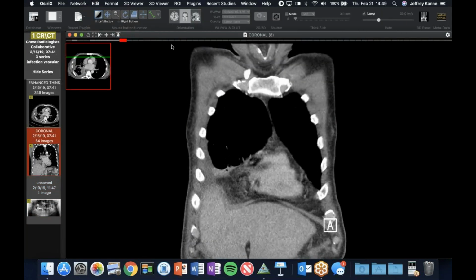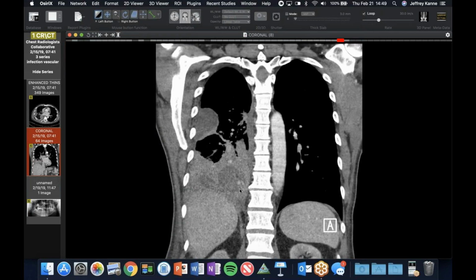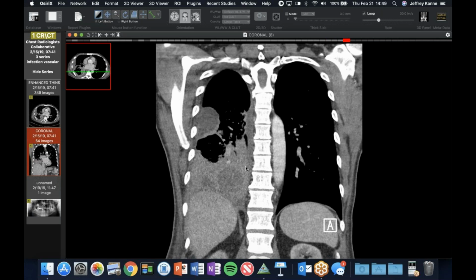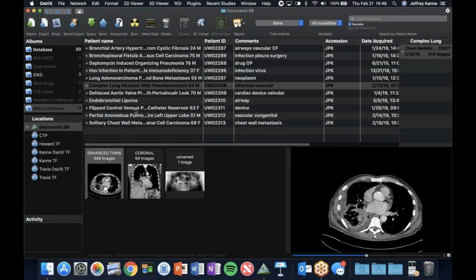And I've seen these get better with treatment. The pseudoaneurysm thromboses, and there you can see it branching on this coronal. It doesn't necessarily require embolization right away, but you have to have a low threshold, because if they start getting severe hemoptysis, you'd probably want to go right to IR and have that embolized and not mess around with it.